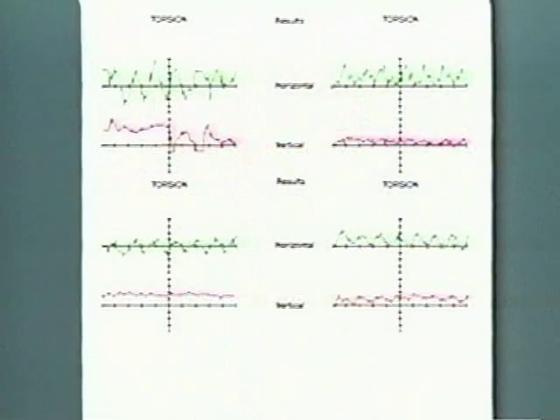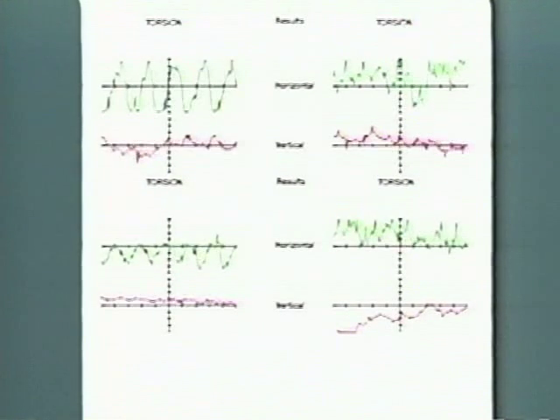Additional examples of torsion swing testing and torsion swing with fixation are demonstrated with these tracings. In the first two examples, we demonstrate a greater than 50% reduction in the degree of nystagmus, which is elicited by turning on of the fixation light. These represent normal tracings. In the next two tracings, we demonstrate some abnormal findings with a less than 50% reduction in the degree of nystagmus after the fixation maneuver is performed. This is indicative of central vestibulopathy.